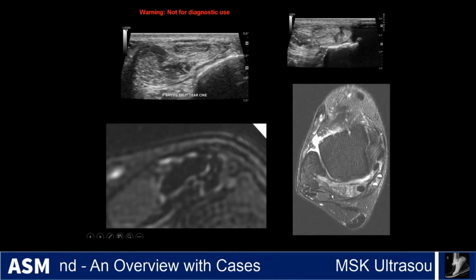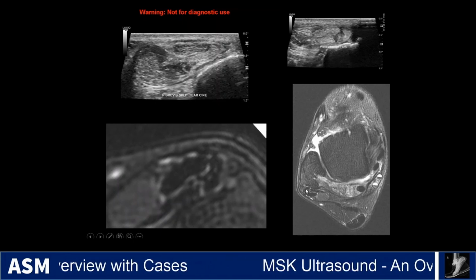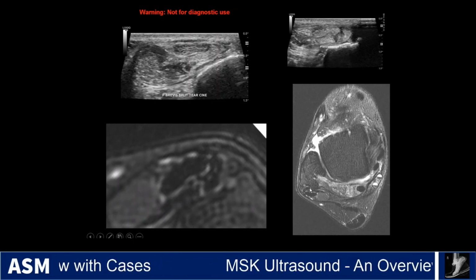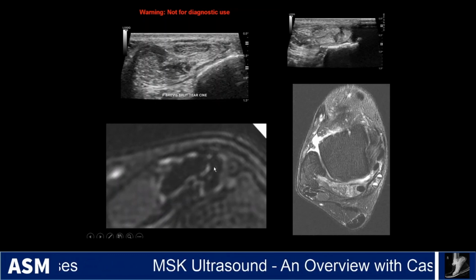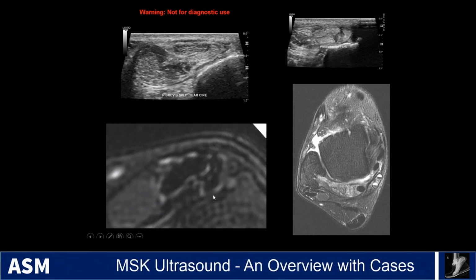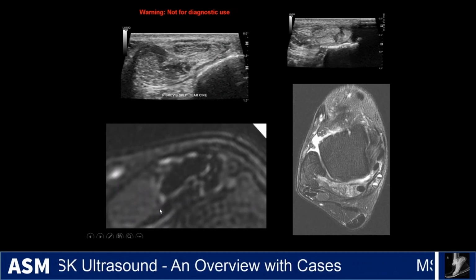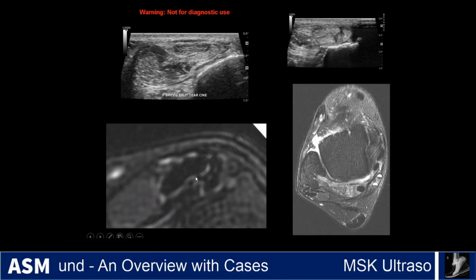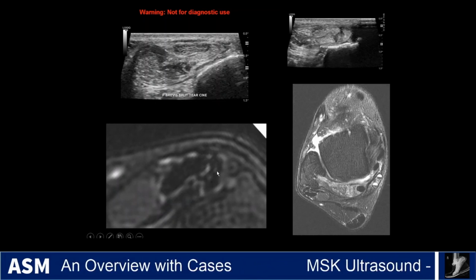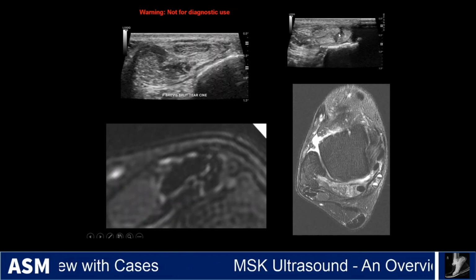This was a patient with lateral ankle pain. You can see the peroneus longus tendon here, the brevis here with the split right here at the retromalleolar groove. I blew this up here and reversed it so you can actually see the orientation over here. So you're looking down, and here is the peroneus longus tendon, the peroneus brevis muscle, and here's the tendon up against the back of the fibula in the retromalleolar groove with this vertical tear splitting the peroneus brevis tendon into medial and lateral bundles. The ultrasound showing the same thing.